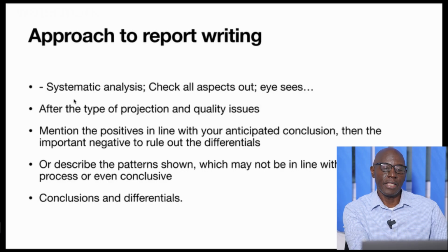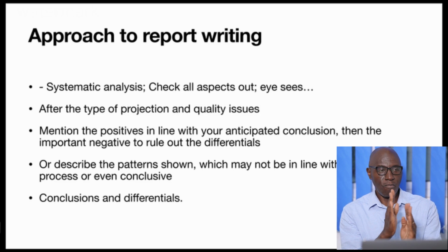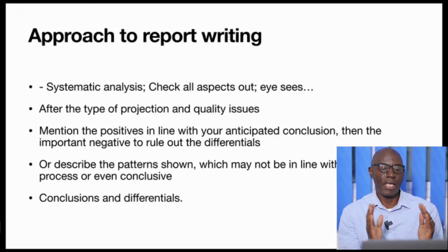But more than that, when one quickly looks at a radiograph, one should be able to conclude what the disease processes are. Just like you see here, we approach the radiology interpretation by looking systematically at the whole radiograph. When you look at that chest radiograph, you must look at all aspects of it. What do I mean by that? You look at the chest wall. You can either move from in to out, or out to in, but I usually want to move from out to in.